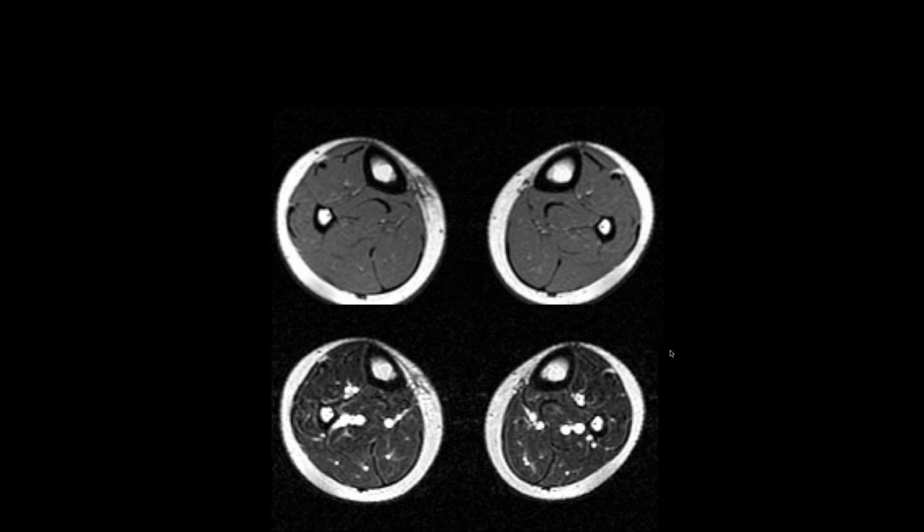Okay, so it's actually within the subcutaneous fat. There's a little bit of increased signal right there, and it's just a soft tissue contusion. So I think the primary lesion really is the bone, but often what you see are the secondary changes of the soft tissue adjacent to the periosteum, and even sometimes associated fat, probably from some hemorrhage from the microfractures of the cortex, which is what's involved with shin splints.